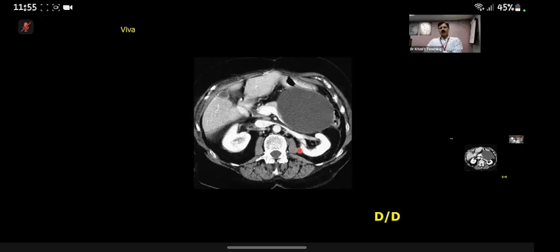If it is a cystic pancreatic tumor, which tumor? Most likely mucinous, because they tend to occur more in the tail region. I do not see any calcification on this one, but they tend to have mural and peripheral calcifications. So if there is one, it would make me suspect mucinous more.